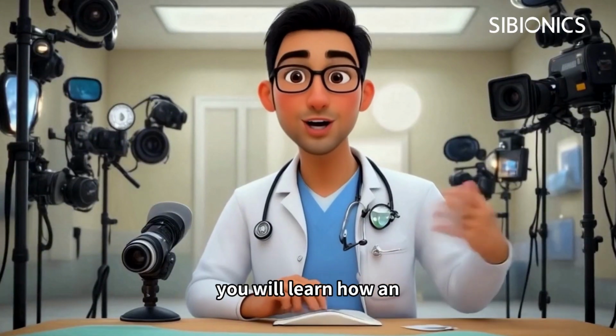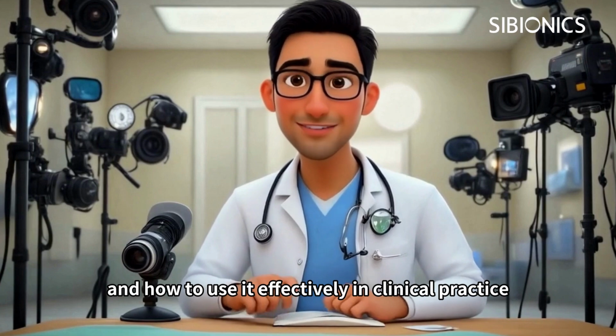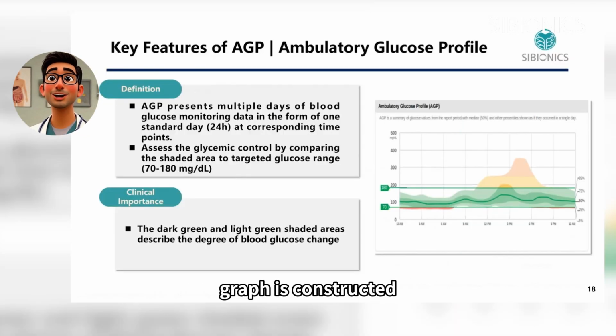In this video, you will learn how an AGP report is constructed from CGM data and how to use it effectively in clinical practice. Let's begin by looking at how the AGP graph is constructed.